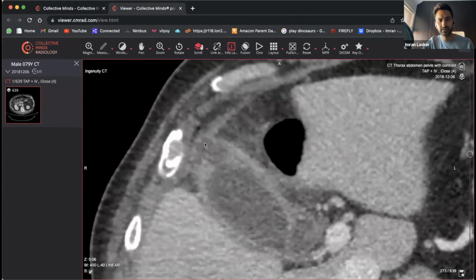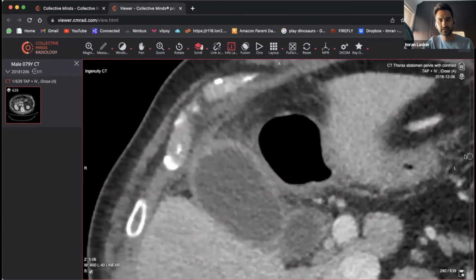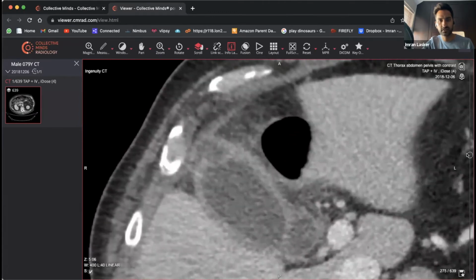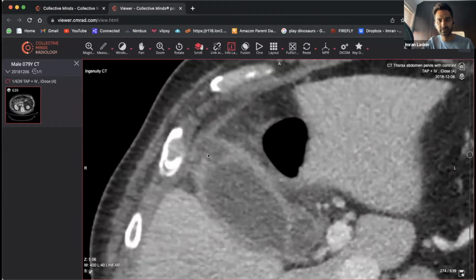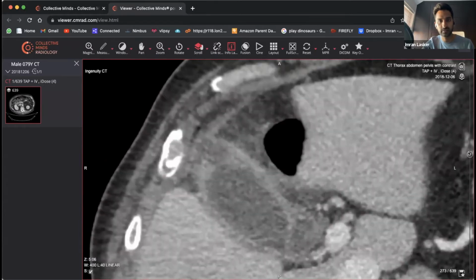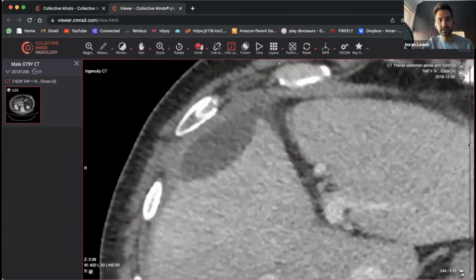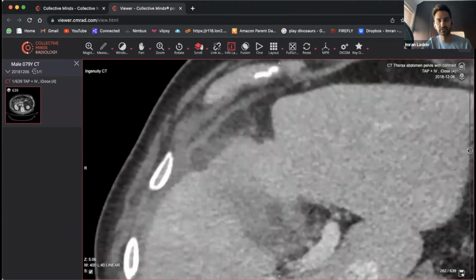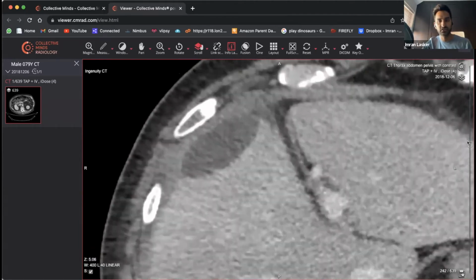And then there's maybe what looks like a little tract there, possibly coming this way. There does look like there could be some sort of defect located within the gallbladder wall. Very, very subtle, but there does seem like there's a bit of irregularity of the gallbladder wall there, and what looks like some sort of collection or some sort of fluidy thing coming forwards superiorly and anterior to the liver, and to be more specific, we're probably looking at segment 4B of the liver.